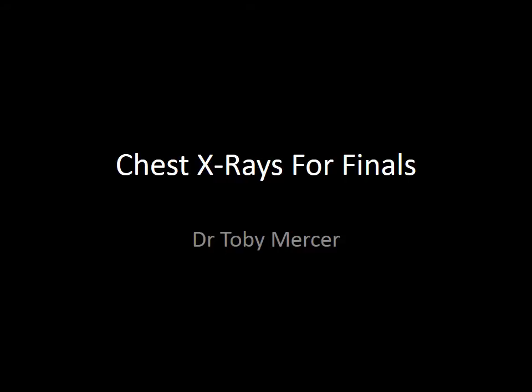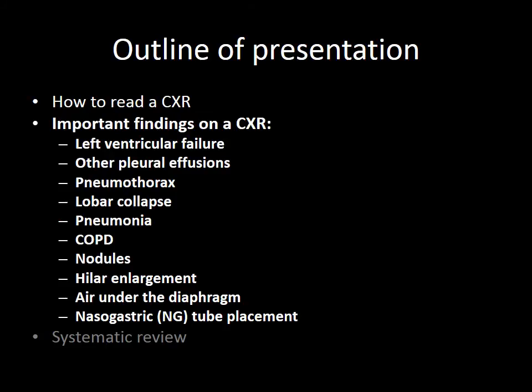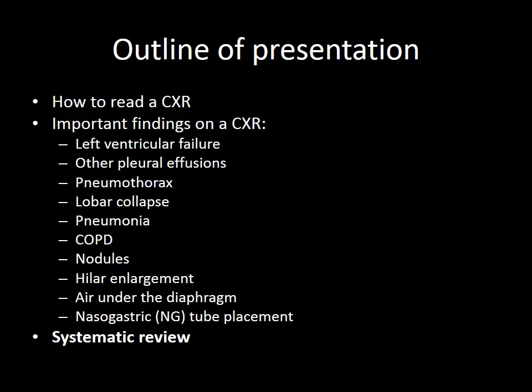The aim of this presentation is to make you feel comfortable and confident in interpreting chest x-rays during your final exams. During the first part of this presentation, I will show you how to read a chest x-ray. Then I will explain important findings on chest x-rays to enable you to spot them. Below this presentation on YouTube, I have included links so you may go straight to any section that interests you. Finally, I will explain how to systematically review a chest x-ray so that nothing is missed.